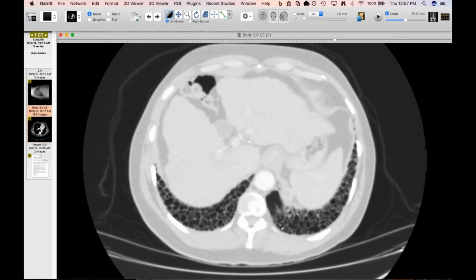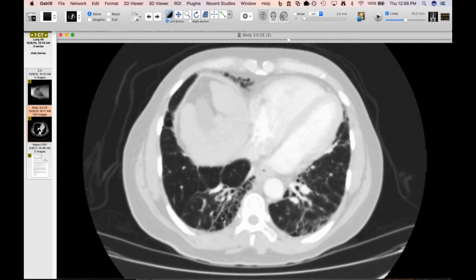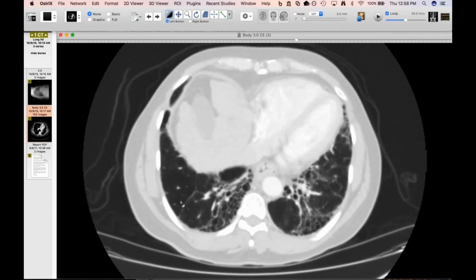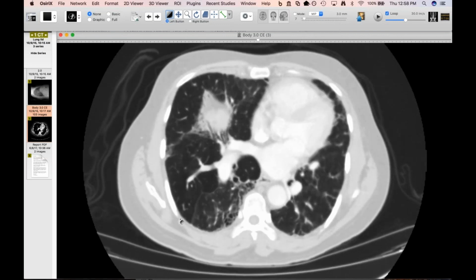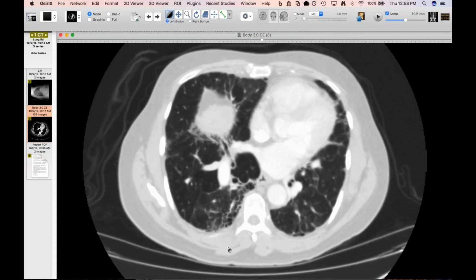So Seth, I'm curious on your take on this too, because I see cases like this. Maybe this is honeycombing and UIP, but the other areas are so strikingly normal, and he now has a connective tissue disease, which certainly doesn't mean he can't have a UIP, but it's just weird. It is weird.